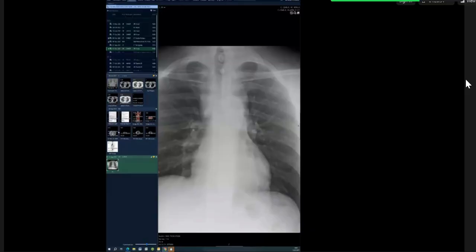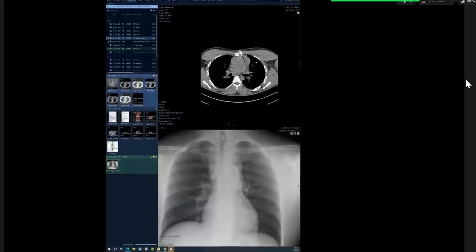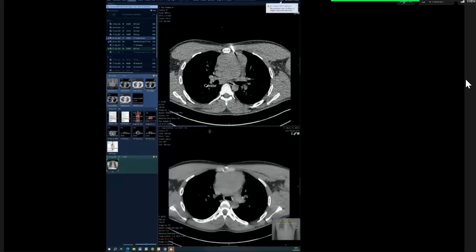When you've picked a superior mediastinal mass, you have to say all the terrible T's. This I think actually turned out to be thymic, but you have to say all of them, and you have to say calcification, no calcification, cavitation, no cavitation, because that's what changes the differential for them, especially when they offer you the CT, because they're not showing you the CT to confirm your diagnosis. They want you to say, I don't see any calcification in it.